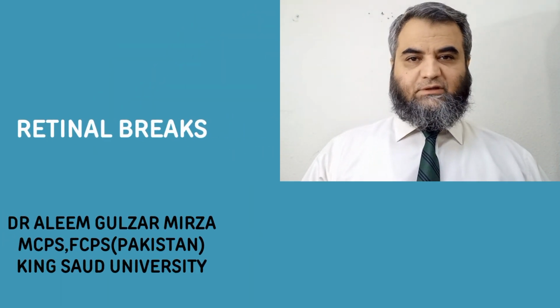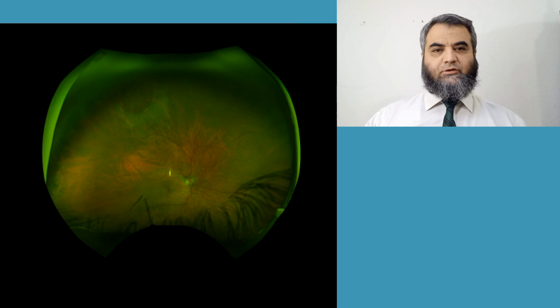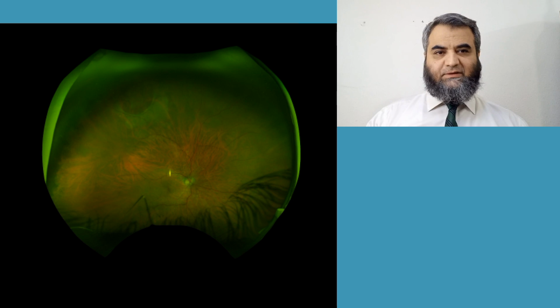Today, my topic of discussion is about retinal breaks. This is a patient who presented to my clinic, a diabetic patient, 60 years old, and his vision was 20/20, both eyes, no history of flashes of light, no floaters. It is a pure incidental finding that I found a retinal tear, and you can see this one in the photograph: this tear is located in the right eye supratemporally.